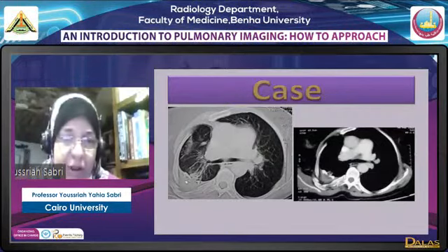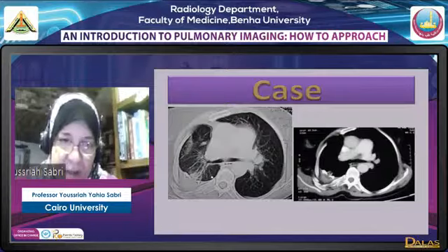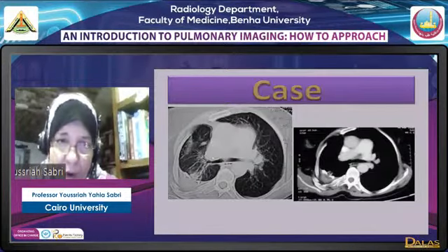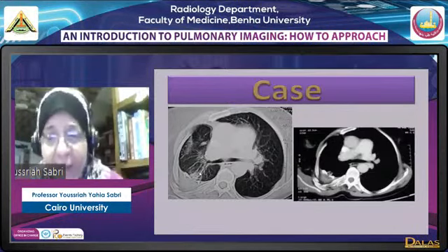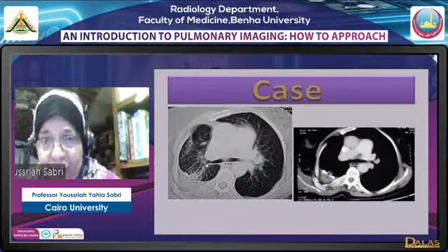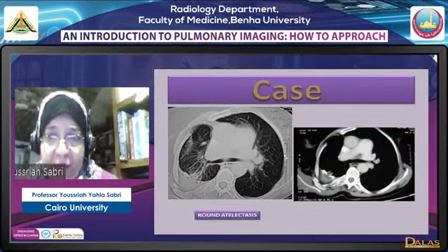Another peripheral lesion, here we have pleural thickening with calcification and a tiny nodule with crowded markings going to it. We have seen this triad before: pleural thickening, peripheral lesion, and crowded markings joining the lesion to the hilum. This is the typical appearance of round atelectasis.